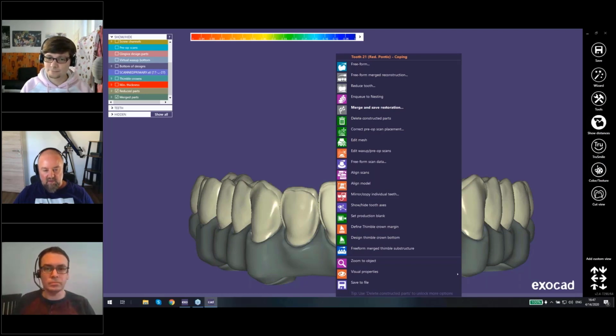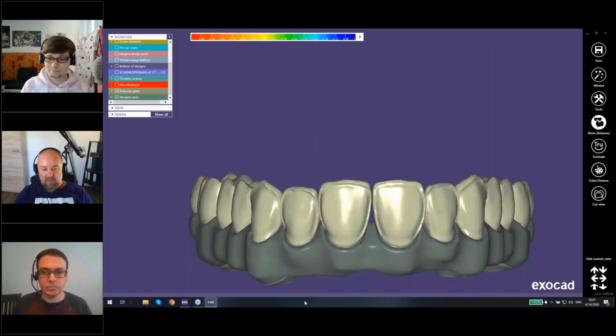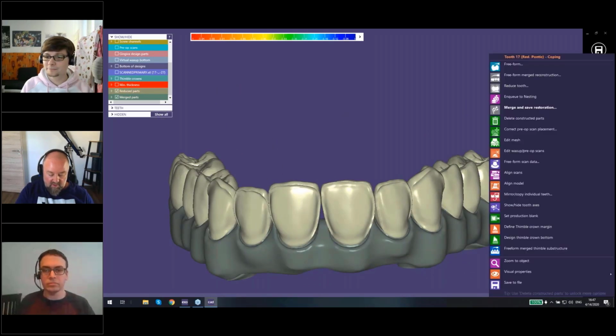Could you just check in the Dental DB? There's a possibility to put the connector. Yeah. So this is, I know that this works. I have to double check if it's not possible in the expert mode. Maybe we have to add that as a feature request then.